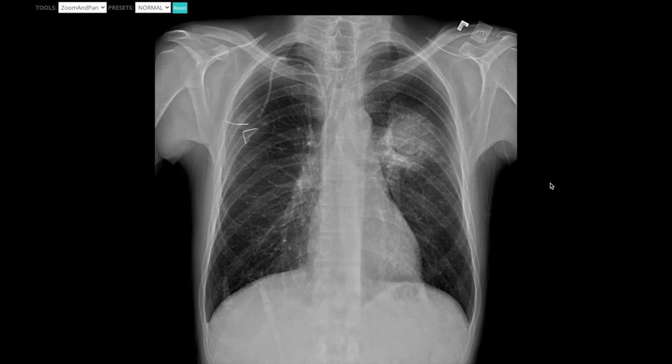In this video, what I want to do is walk you through my general approach to a chest x-ray.